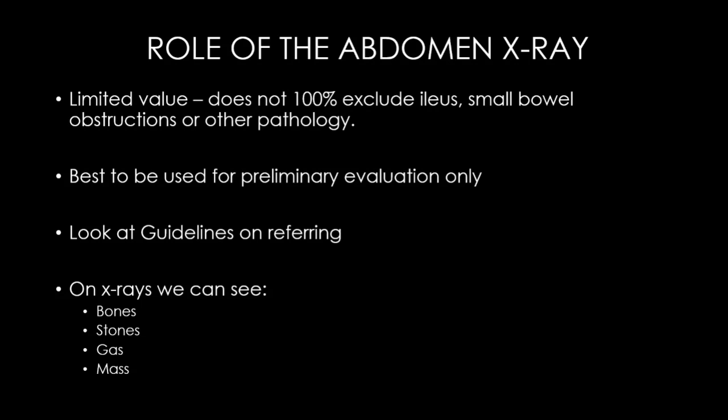Essentially, volvulus is where the bowel twists on itself and becomes dilated due to the air being trapped in that section of bowel, but we'll talk about it in more detail in another video.